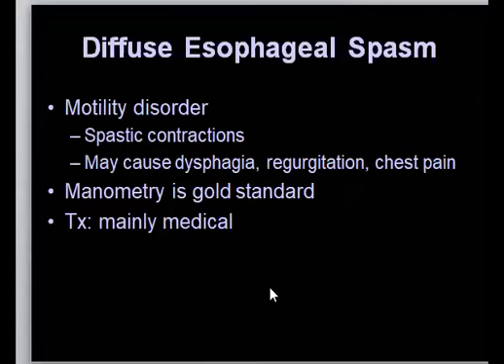So what about this one? This is a single contrast esophagogram, and yes, there is... Perfect. Okay, so this is what is called diffuse esophageal spasm, and it happens when there are numerous contractions, and it looks like a corkscrew. Yeah, corkscrew appearance. Perfect. Manometry is the gold standard.